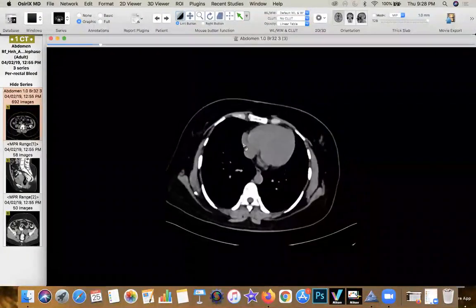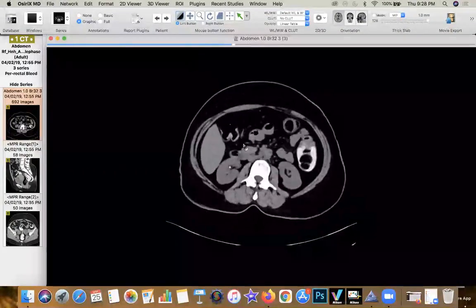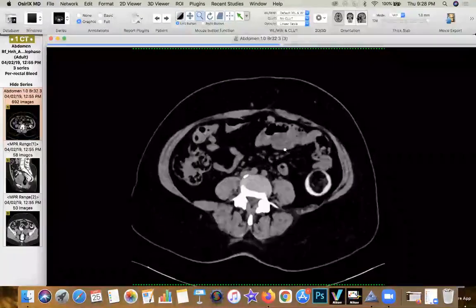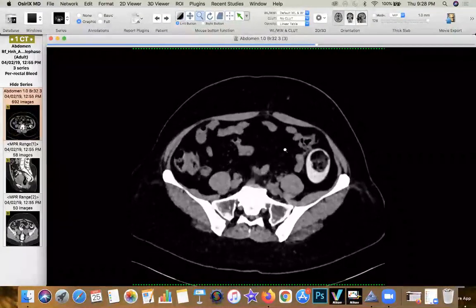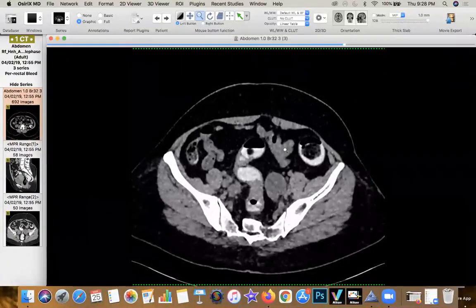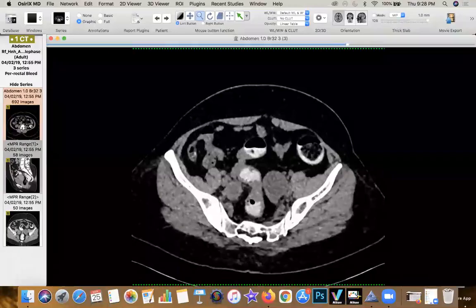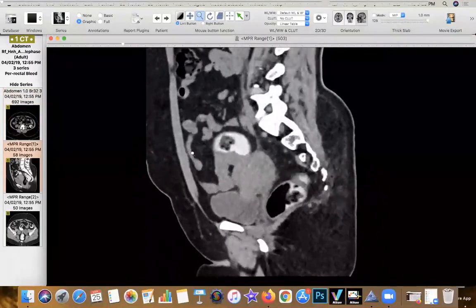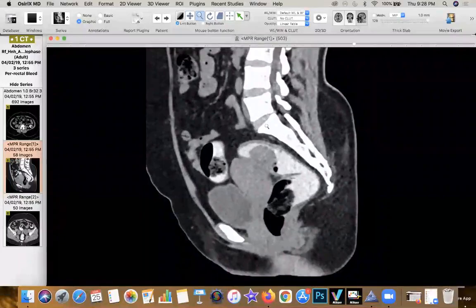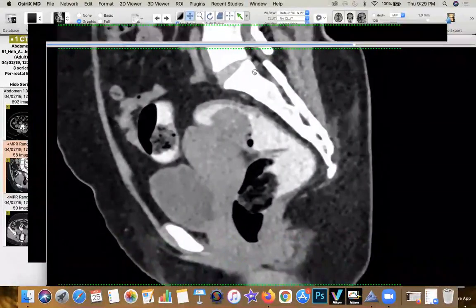So we have a patient in her early 30s, you can see. I'm doing the CT. CT is not usually the way we actually assess the pelvis. For us, we do MR in every pelvic pathology as much as possible. And this patient actually presented with a perrectal bleed. And I'll show you the sagittal recons rather than complicating the whole stuff. And if you see the sagittal recon, it's got a pretty sinister look to it.